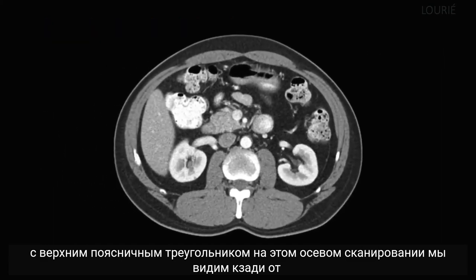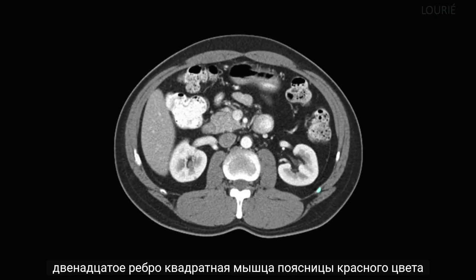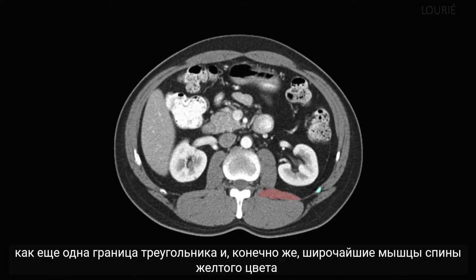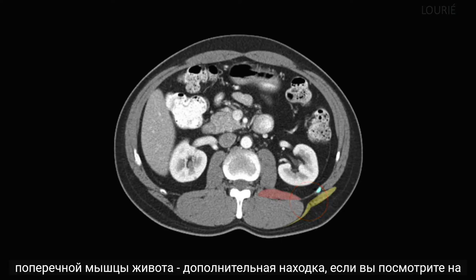In this axial scan, we see posterior to the kidney, on the left side in blue, the tip of the 12th rib. The quadratus lumborum is in red as another border of the triangle, and of course the latissimus dorsi in yellow forms the roof. The floor of the superior lumbar triangle is formed by the very thin aponeurosis of the transversus abdominis.